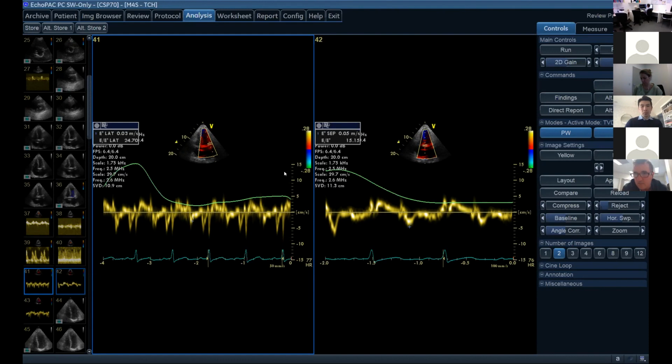Well, it's often, let's say, more normal, and there's then this discrepancy between the medial and the lateral. Why am I showing you this? What am I showing you an example of here? I've got Louise here who's going to talk as well. Louise was just saying it. So it's low. Let Louise have a word.